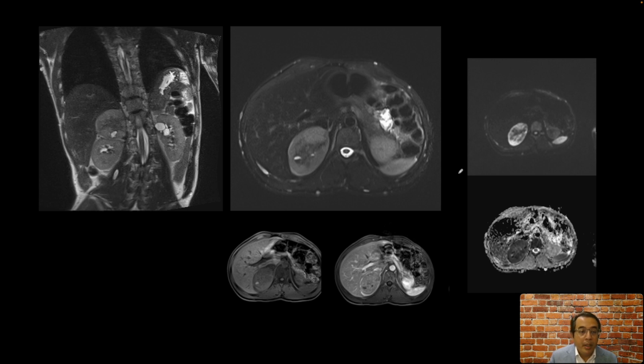This is our next patient. They presented with headache and palpitations, and they first underwent a CT which showed a mass arising from the right adrenal, and then they had an MRI to better evaluate that mass. This is a large mass that is arising from the right adrenal. We are seeing some T2 hyperintensity in this focus. Also seen here on this axial fat saturated T2 weighted image.